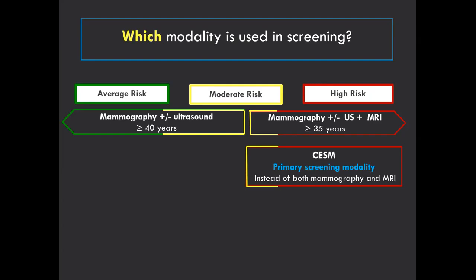Because why do a mammogram and then prefer the patient to perform an MRI examination when we can get the same results from one examination? But up till now, due to insufficient data, contrast mammography is usually used in the diagnostic workup of the recalled patients from the screening programs, and it might sometimes be recommended for the follow-up of some patients, and we will see some applied examples.